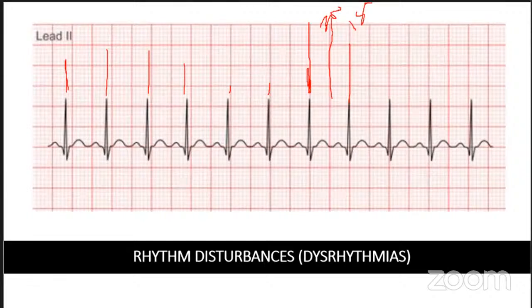Okay, so just to recap all of what we did today, we looked at the ECG rhythm, looked at the origin of our P wave, our QRS complex, our T waves, and we looked at our intervals and the segments. We talked about what the duration should be, and we also looked at how we can calculate our rates.